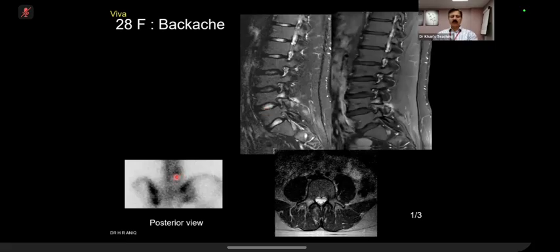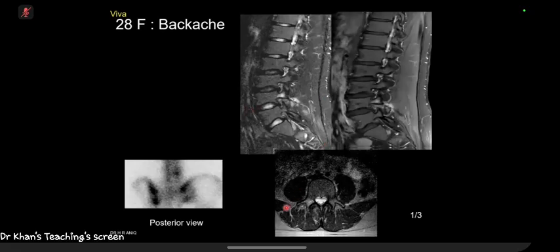There is an uptake here. What do you think is happening? Over to you. Okay, so on the selected sagittal MRI slices, there's high STIR signal in the pedicle of L4, which I think on the axial correlates to the right pedicle, sorry, and also some increased T1 signal.